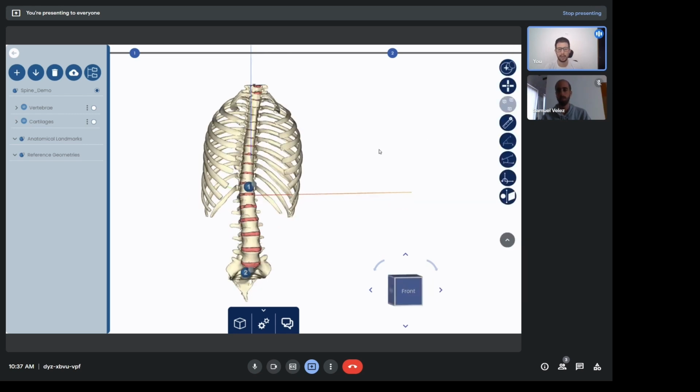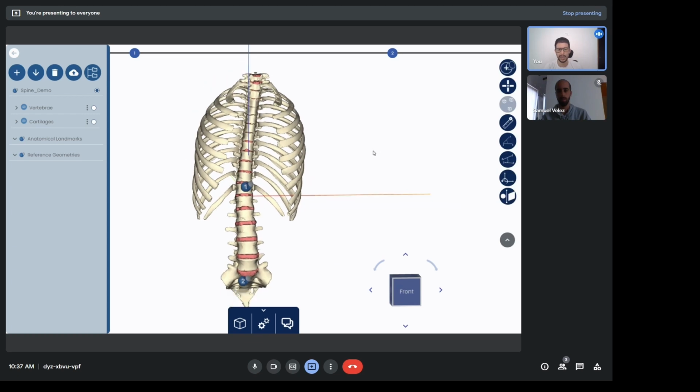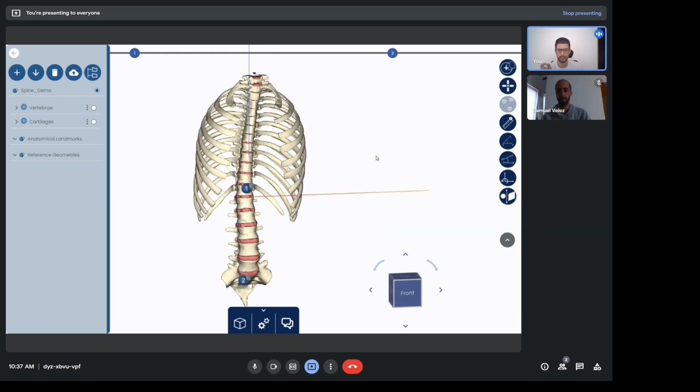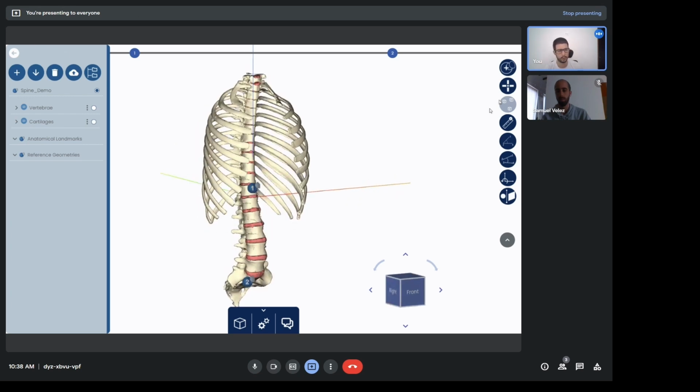Additionally, a doctor might want to highlight or use a particular point in the geometry to specify a procedure, or a sample taken, or a part where an implant should touch, and that's where we use the anatomical landmarks.